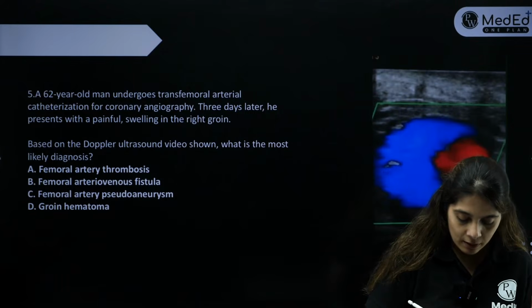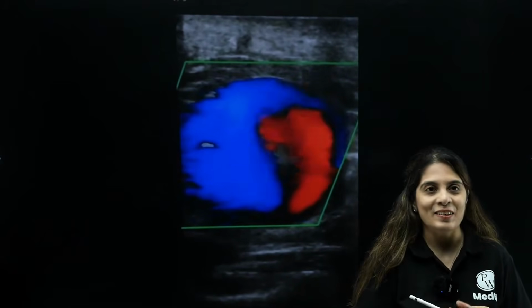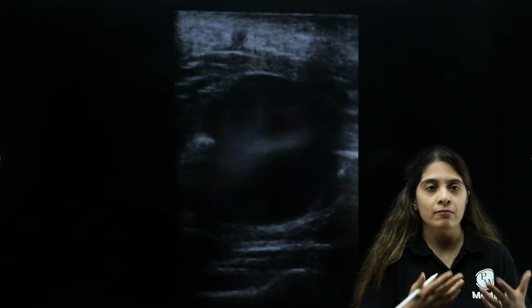I am first going to display the video for you, and then I will read the question. So what is this classical sign? Okay, everyone has seen the image. Now we are showing you the video.